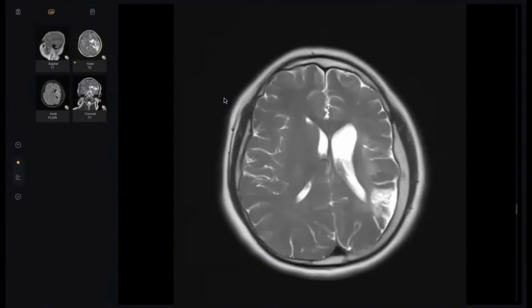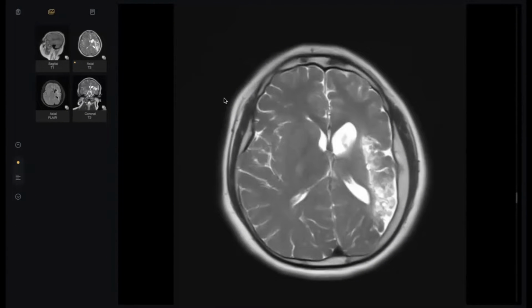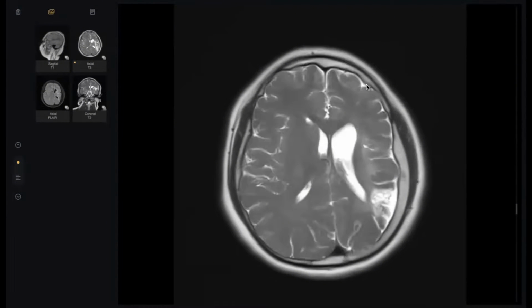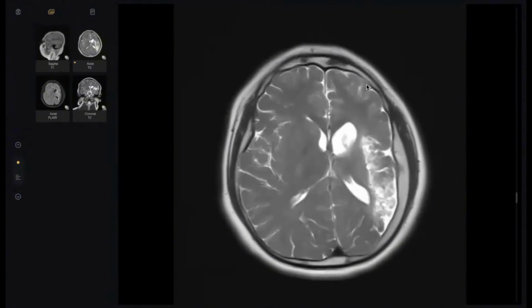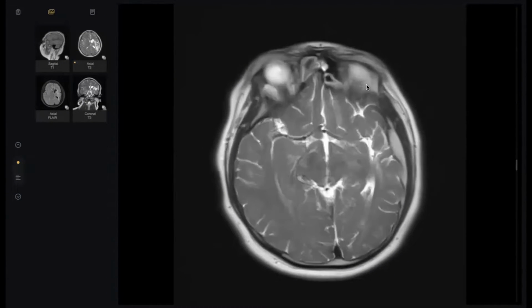Second point, the Rasmussen is more focal, almost affecting one lobe of the hemisphere. But the Davidoff, as you see here, almost affects the whole hemisphere. See here, the whole hemisphere is atrophied. Doctor, you are very brilliant. But another last question. What is the underlying etiology of this Davidoff-Masson syndrome?